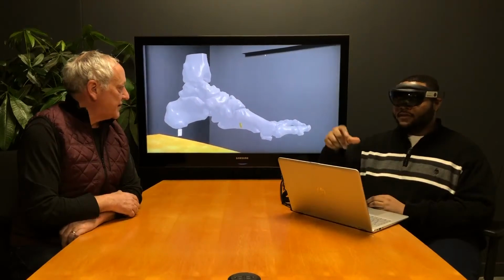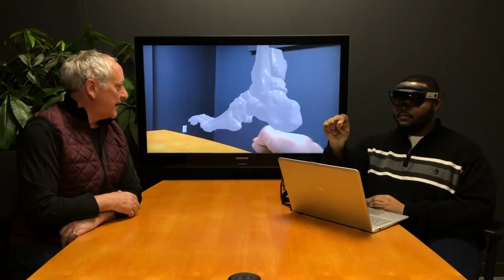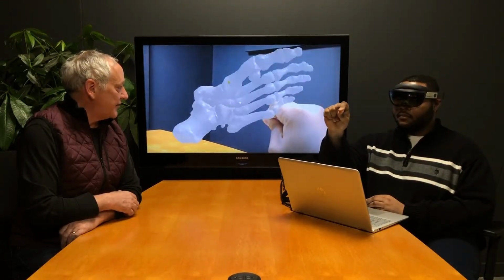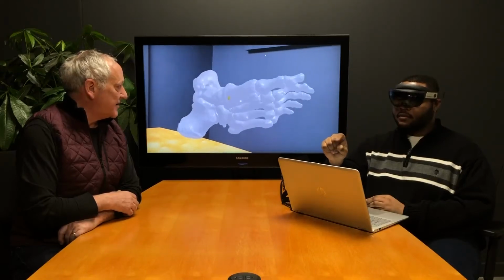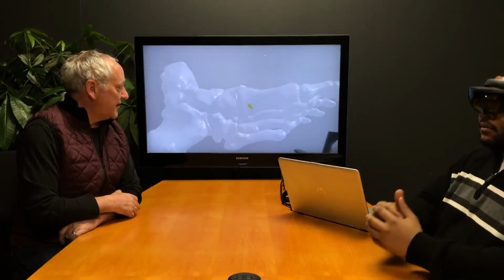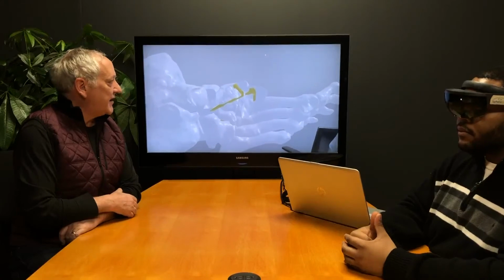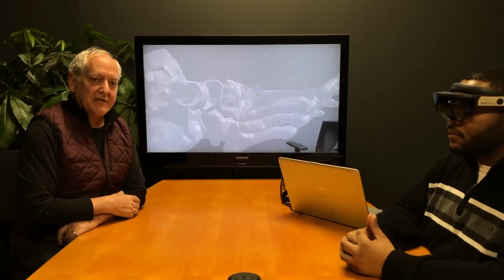All right. So first I'm just going to rotate this just a little bit. Okay, great. And so we can again see that nail in the foot. Now can you show us the path of that nail? Sure thing. So by just moving forward and actually moving into the hologram, you can see the internal detail, and again, we can follow the path of any one of those nails within the organ itself.